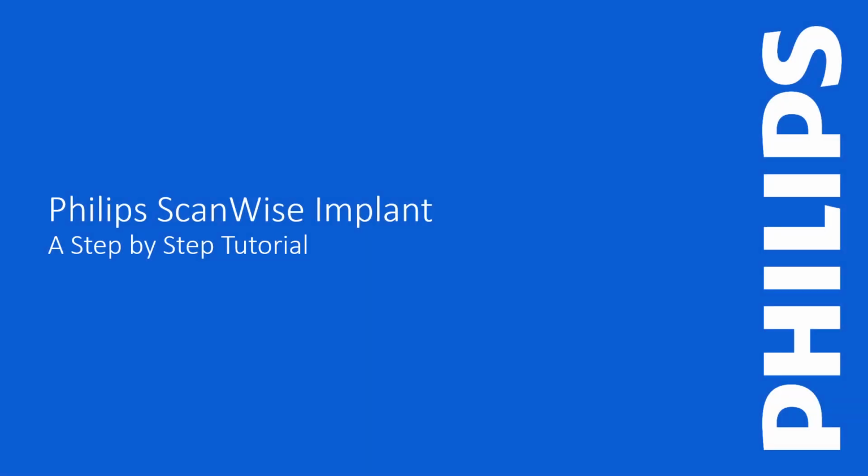I would like to welcome you to a tutorial on Philips ScanWise Implant. This is a step-by-step tutorial on how to use this product.